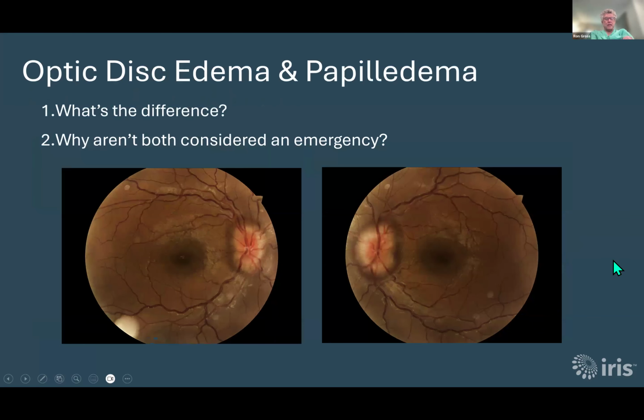And I think next is last. Here you can see, whereas before when we were looking at the optic nerve, it was a kind of round oval disc that had very well-defined margins. It was a very sharp margin. Here you can see it looks much fuzzier. And the reason it looks fuzzy is because the intracranial pressure is elevated, and it has blocked off the flow through the optic nerve, which has caused things to back up and caused optic nerve swelling.